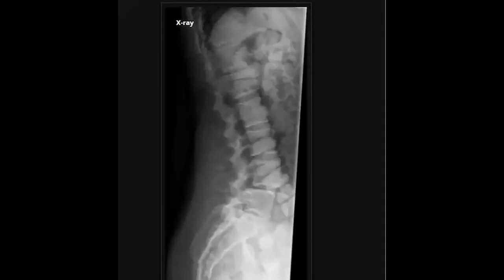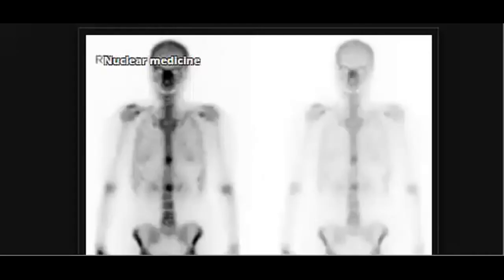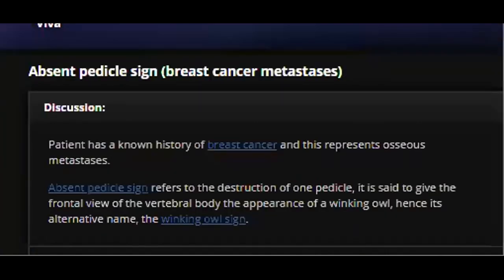This patient has spondylolisthesis as well. So what do you think? When you go to the bone scan, you have one here and one here. Yes, Dr. Gada, perfect. So you are thinking about metastasis. This is a female patient, so the best primary will be breast cancer. Perfect.